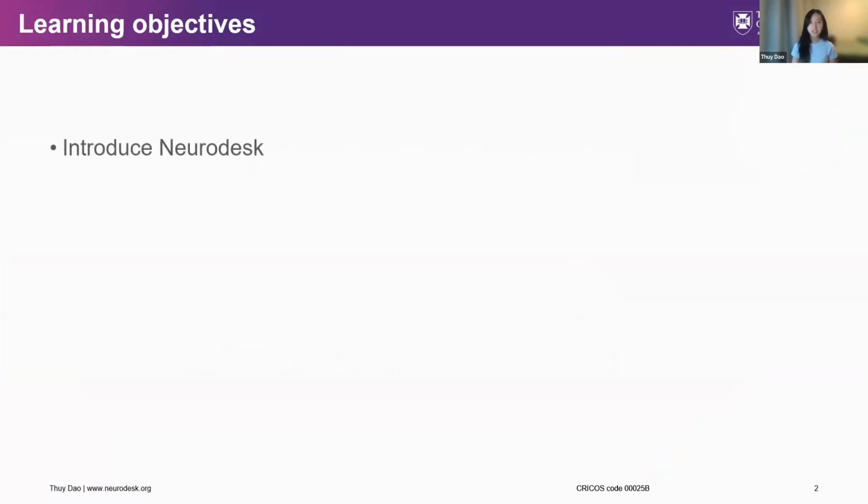And here is the outline where I first will start with Neurodesk, developed by my group to simplify neuroimaging workflows. In the previous talks from Aswin and Stephen, they already covered what it is, why it's important, and our development journey. I will now give you a more hands-on demonstration of how it can make your work easier.